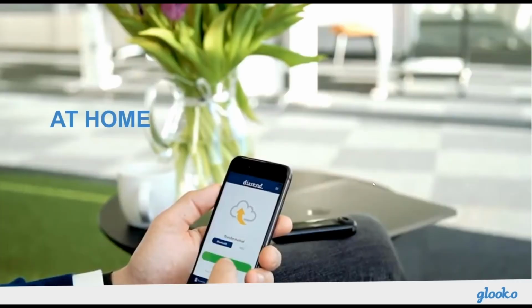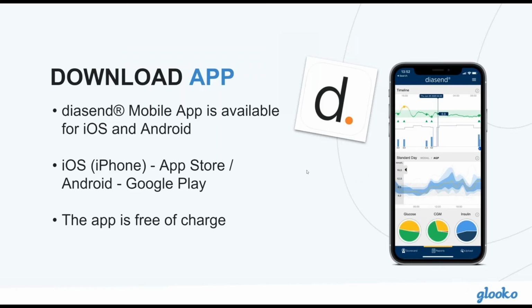First of all, we're going to cover using smart insulin pens at home, how patients would upload this data and the process that they would follow. So first of all, a patient needs to get the diasend mobile app, and they would do this by going to the iOS or Android App Store and downloading the app for free.